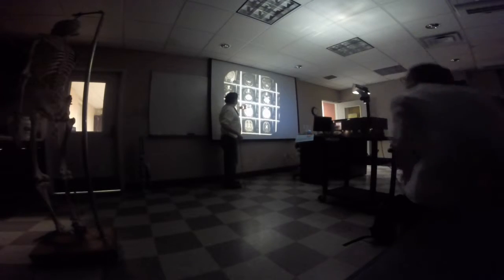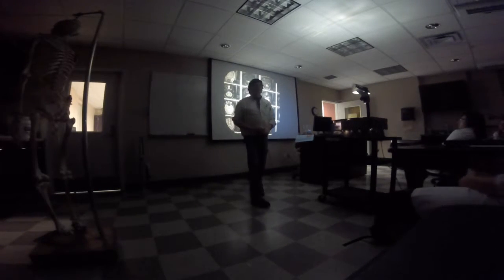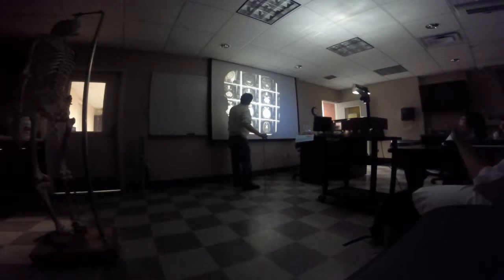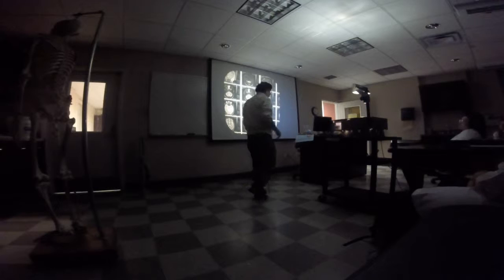Definitely. What do you think is located right here, this dark area? The retina? This is the eyes, but what is that dark area there? The retina would be along the posterior aspect. That would be where the lens is located. That would be the location of the lens.